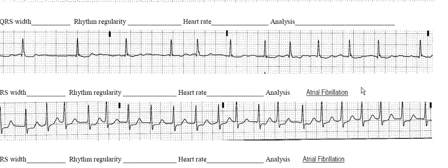And I've provided you what this answer is. We haven't learned it yet, but this is an atrial fibrillation rhythm, an irregular rhythm with no P waves.